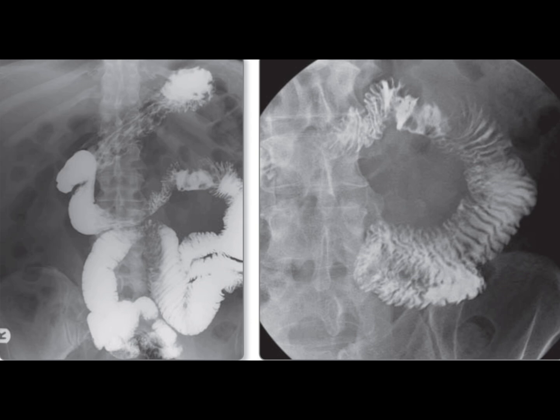Key points for small bowel barium studies. It's crucial to be confident in your knowledge when performing a barium study of the small bowel. Always consider the number of visible lesions. Multiple lesions usually indicate a benign pathology, often associated with conditions like Crohn's disease. Solitary lesions, although less common, are more likely to be malignant.